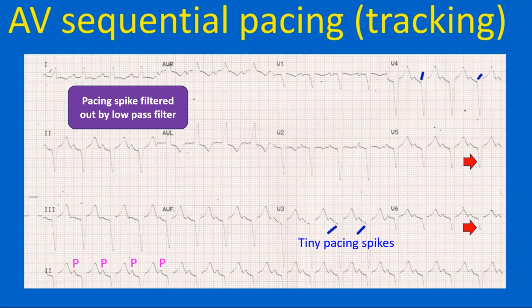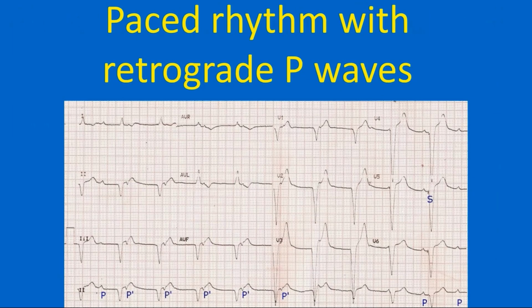The discordance between the QRS patterns in leads 1 and AVL versus V5 and V6 should make one suspect a pacemaker rhythm and not a simple LBBB pattern. In simple LBBB pattern, there is concordance between the lateral limb leads and chest leads. This ECG shows a wide QRS rhythm with LBBB pattern in 1, AVL and V1. Axis is leftward and V6 shows negative QRS complexes, indicating pacing from the right ventricular apex.